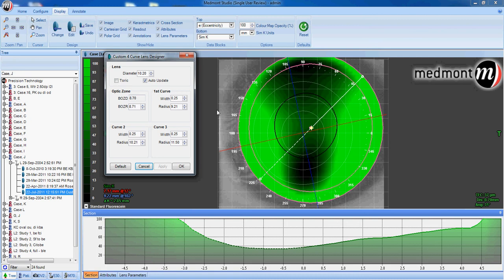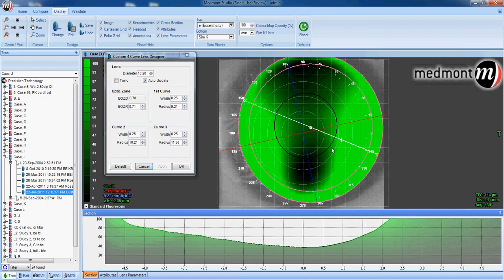We desire somewhere between 30 and 40 for a diseased or asymmetrical eye. In a normal eye, we want around 20 to 25. Since we have 37, we'll consider this a healthy amount of apical clearance. Next, we'll drag this white axis line to the meridian with the greatest bearing.